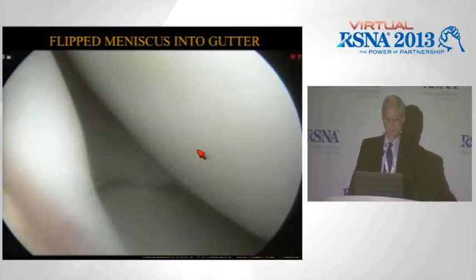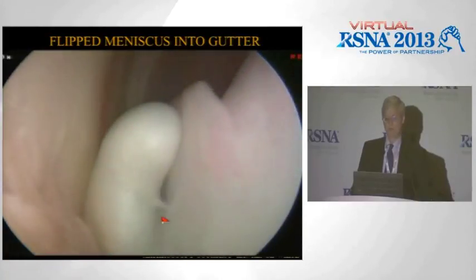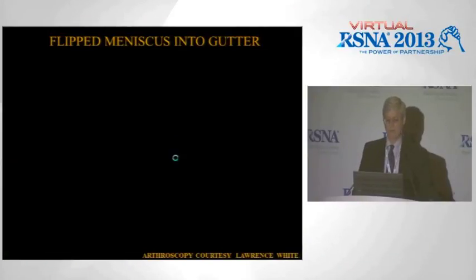And I have two video clips. And you're going to see that big piece. There it is, flipped forward, and there is the meniscus right there from where it came. And I have one other video clip.